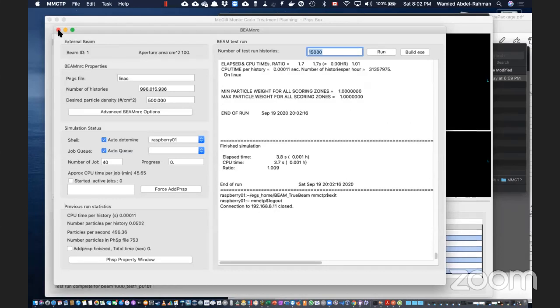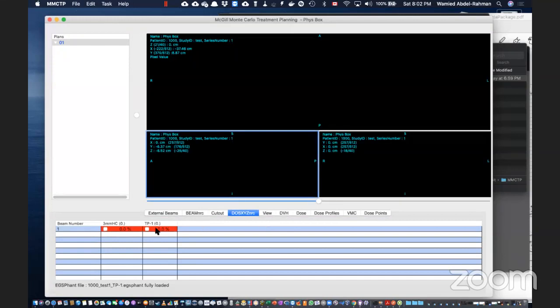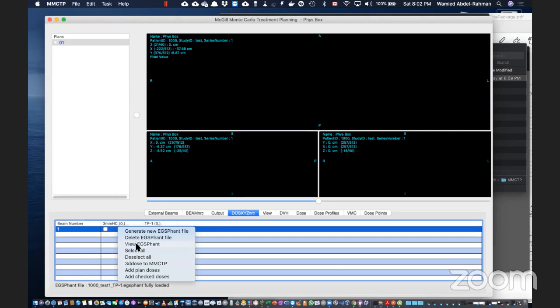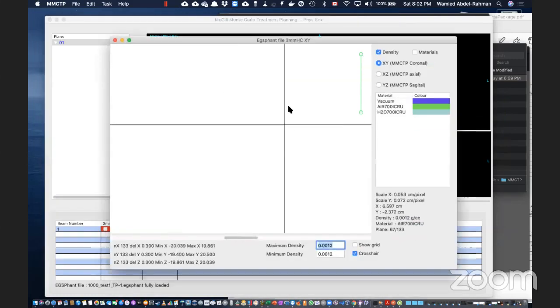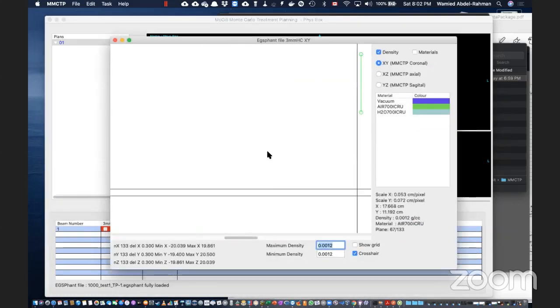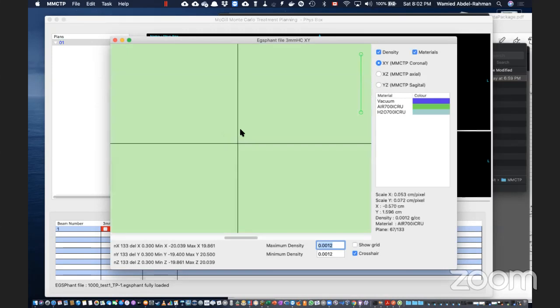Okay. So now the dose XYZ simulation, this is where I struggle. Okay. If I look at the phantom, I'll show you what's my concern. Okay, view X phantom. This is a problem I face. Now the phantom is air. Everything here, if you look at the density, it is air. And by material, it is air. Okay. That has to change to water. How do I do this?